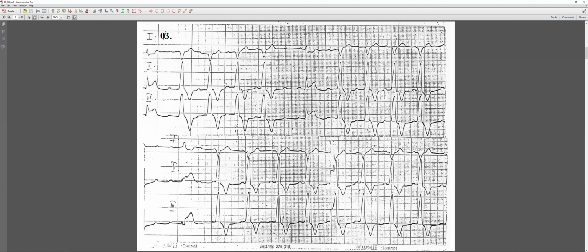Use your cursor. So these ones are conducted in lead 2. Those are conducted. If you look at the top panel, the middle one is conducted, only the middle one. Why? Yes, that is conducted. But why?